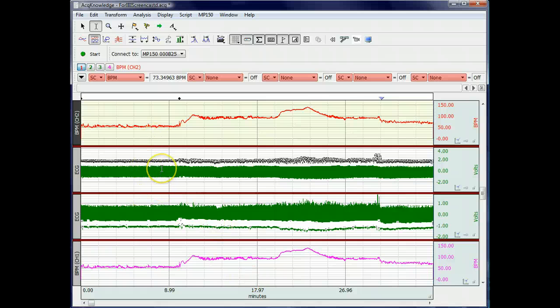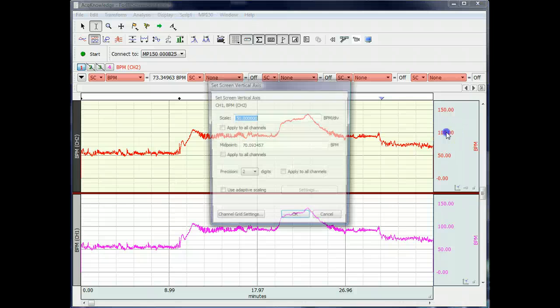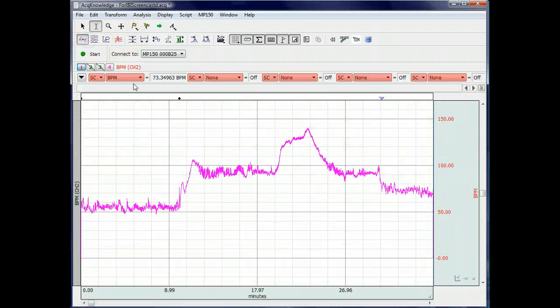The point of that is to show you that even though there are tricks that you can apply to try to clean up something where your first run through isn't perfect, you always want to keep your mind open to other possibilities. If we do a direct comparison of these, hold down the Alt key to hide these channels and make sure that theirs are on exactly the same scale, and then overlay them.